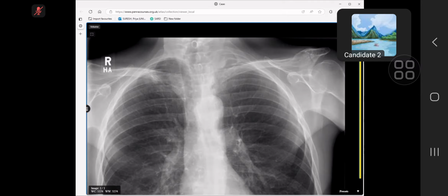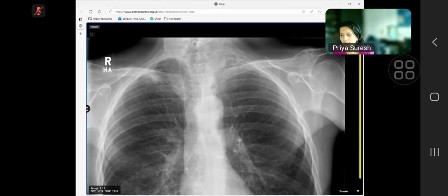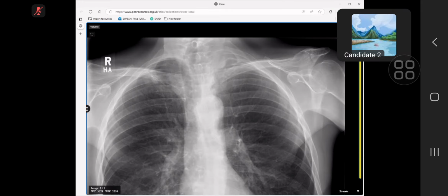So I suspect that in this location, it is extending above the clavicle. It is definitely a Pancoast tumor, and its location is causing the erosion effect on the nerve and bone. I would like to see its communication with the underlying cord and neurovascular bundle, plus the soft tissue density of the neck on both sides is also different. So I will proceed with a cervical neck MRI with contrast.